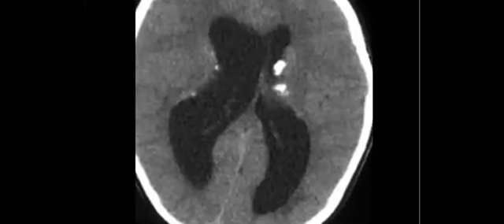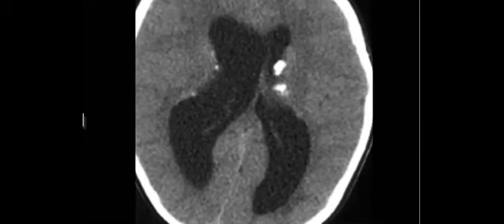Okay, go to this one, which is an easy one. Tuberous sclerosis. Yes, you can mention calcified subependymal nodules, equal in differential diagnosis to tuberous sclerosis, one of the big differentials. And we mentioned TORCH already, congenital TORCH infection. Yes, I agree. HIV, toxoplasmosis, cytomegalovirus. So you can mention that it can be one of the calcifications that you should put in your differential diagnosis list. We mentioned in neuro the details about it.